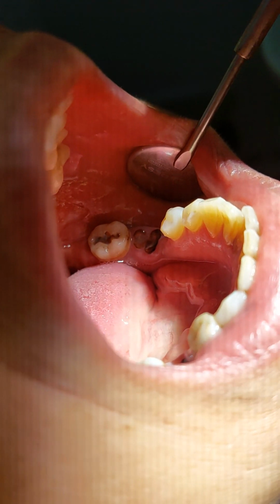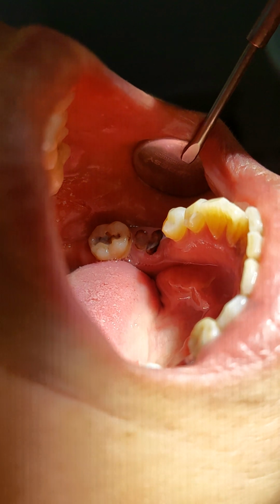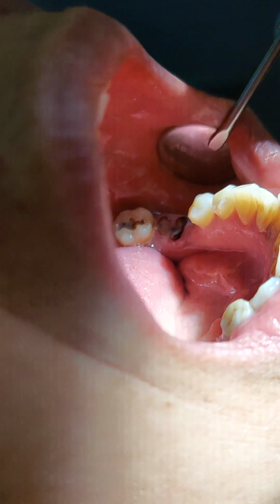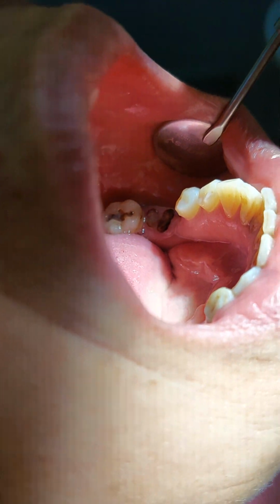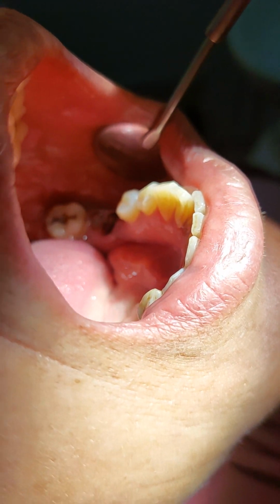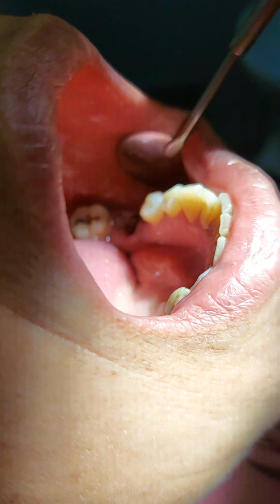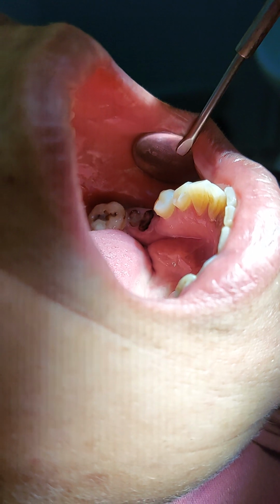Okay, Assalamu alaikum. We have this case where we're trying to identify teeth before we treat them with bridge work. This case came from the student and is still in its initial form. There are still some extractions and perio and many things to do. But the discussion point was, is the last tooth a 7 or an 8?